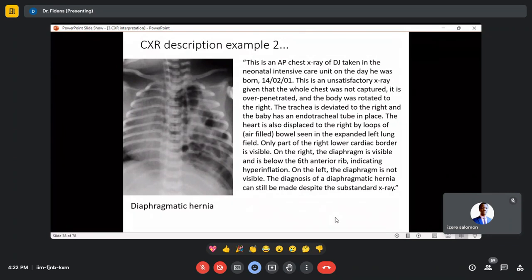I can see the heart. You can see the heart? Yes. It is thin. In totality, it is thin. Have you ever seen some structures like this in the chest?